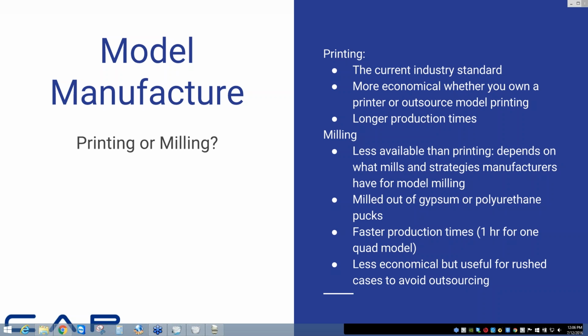I have a question regarding creating the STL files. When you finish Model Builder and it generates the STL files, as long as the file exists, it should be ready for any system that you're going to mill or print it on, as long as it accepts STL files, which most do. They shouldn't be any different from any other raw STL file, except it's a shape without holes in it. So it should be ready to go as soon as you finish Model Builder.